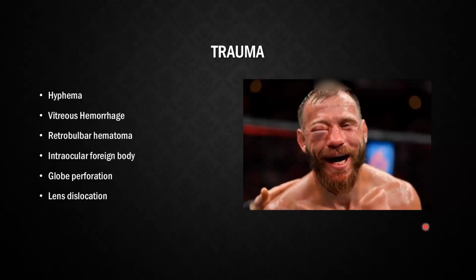Okay, so let's go through some trauma. Keep our intoxicated patient from the beginning in mind while we're going through this. But these are the various different pathologies that you can see in trauma. Some of them you can see without trauma also. So these sections kind of overlap a little bit.